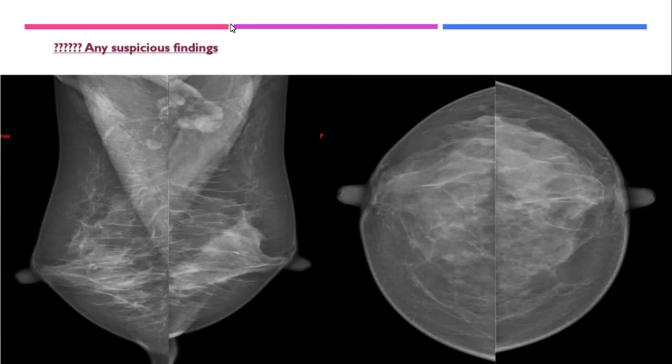Hindi said right. Where in the right side? There are multiple in the medial part, I don't know if these are masses or multiple. In the left also there is something central, just at the level of the areola, at the center here, and towards the posterior also, and here. And in the right, in the medial part, I can see small areas here.